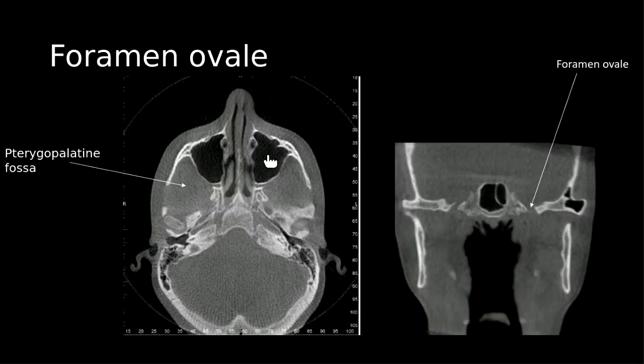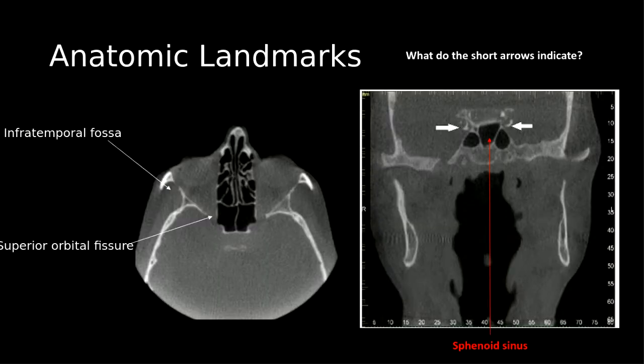And then you can also see the foramen ovale, which goes from this area, and the pterygopalatine fossa, where you have the pterygomaxillary fissure and all these important nerves and vessels going all the way into the sinus, and that go through the foramen ovale. So if you have any inflammation, injury from dental inflammation or fracture, or if some implant goes through the sinus and on the top, then the infection goes straight into the cavernous sinus, and the patient will have brain injuries in that area.